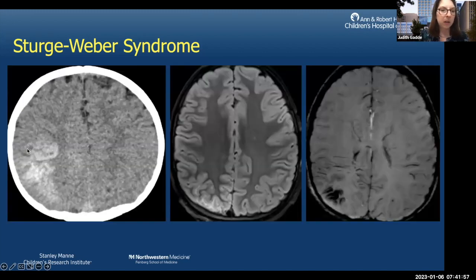So this patient initially presented here. This is a non-contrast CT here on the left. You might think maybe there was some enhancement and we gave contrast, but of course, always important to look at any of the vessels. If you see the dural venous sinuses or cortical veins, that can be a hint whether or not you gave contrast. But here we see some hyperintensity. So we weren't sure what was going on, recommended an MRI.